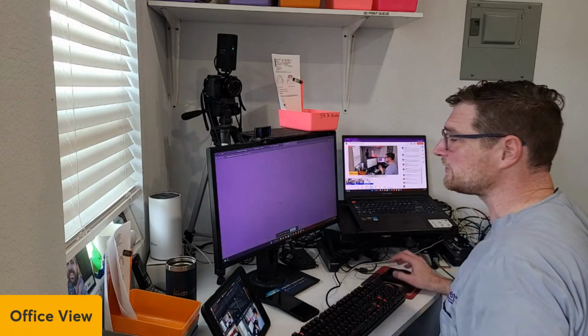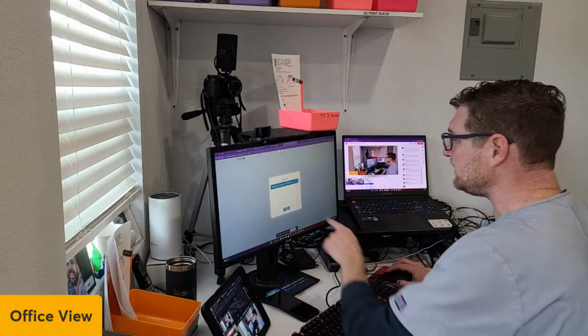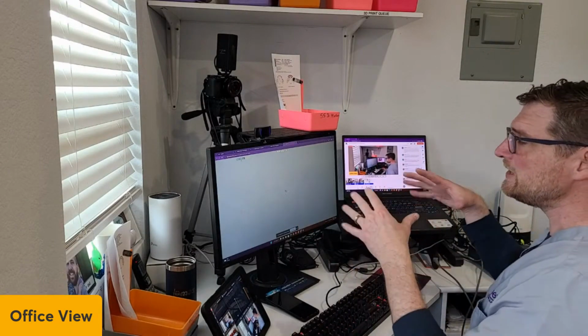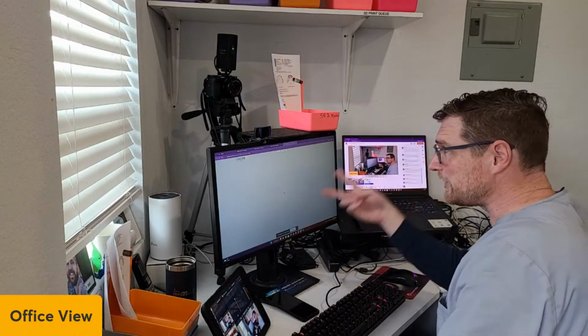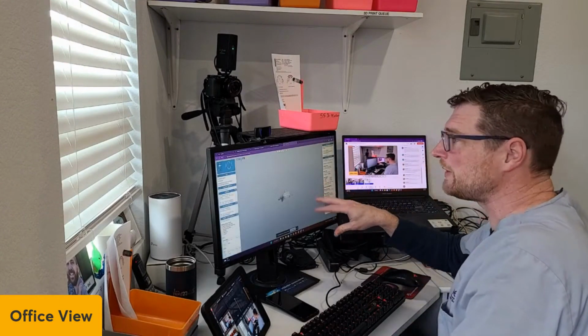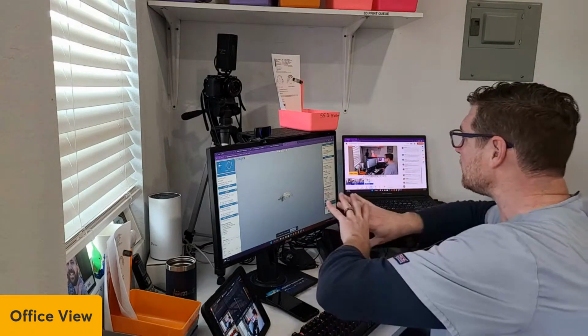So you actually just click on that file, and then I got two options here, view and edit. I'm going to click edit, and this may run a little slow because I'm actually live streaming and trying to run this. So this will give us some time to talk. So if you have any questions while this loads, I can answer those questions. So it's going to load a work area.